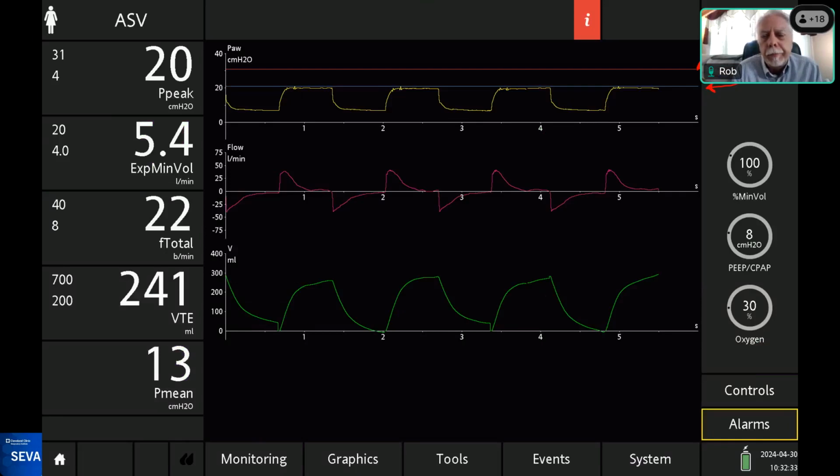Right. Can I say something, Eduardo? Of course. Yeah, it's very important in this mode to monitor the pressure that the vent generates, because in this mode, if the patient keeps on improving, it's going to get automatically to an SBT. So I think the minimum pressure is going to decrease. It's going to be PEEP plus 5. In a few words, it's one of those modes that we have available at the Cleveland Clinic, and we can use it from the start, because it meets the 3 goals: safety, comfort, and liberation. So sometimes we can observe the patient already being on 5/5, and that's when we start to pay attention and say, well, ASV is weaning the patient by itself.